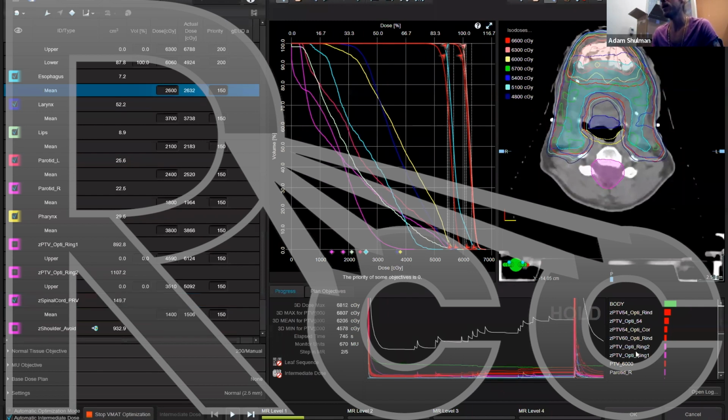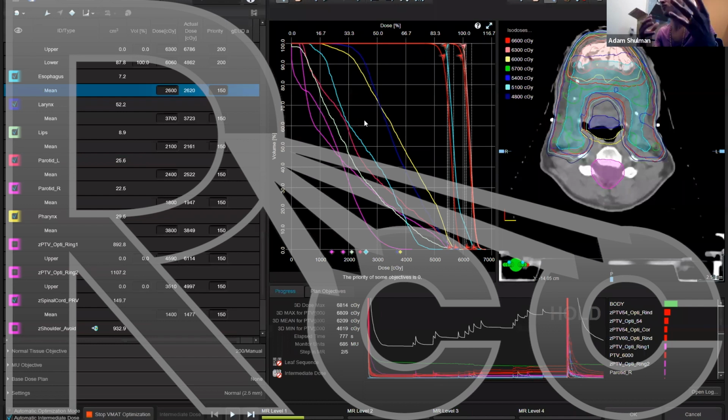So right now we're just waiting. So again, a lot of our optimization will be done early on, and then as we move forward, we'll fine tune those MLCs. So you don't want your shoulder to drop too much. If my shoulder dropped all the way down to here, that means that we just pushed everything too hard. We've only dropped a little bit from about here. Probably we were just below this 95. We only dropped from about here to here. We haven't dropped our shoulder much. Again, we don't want to have drastic drops in shoulder. It just means that we've done too much optimization.